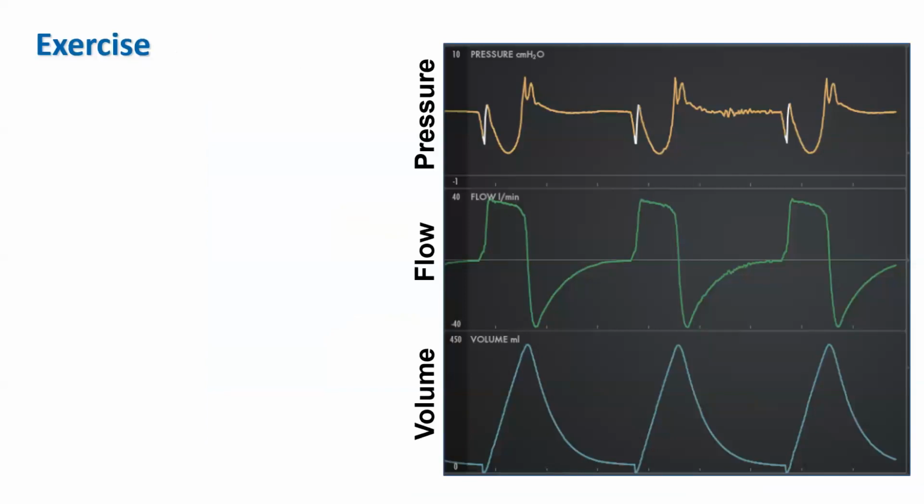What's this? Take a close look at it. Doesn't look good, does it? What do you think is going on here? Well, what we start off with is, what is the tag?